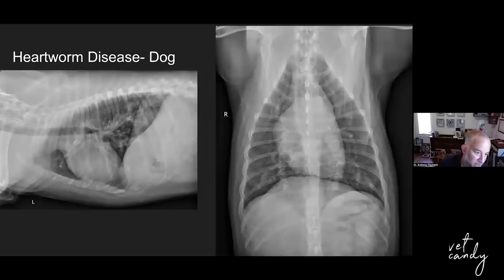And look at this pulmonary artery relative to the vein. Remember, we said artery is going to be here. That's the bronchus, and then the vein is ventral. Look at how the pulmonary artery is this thick and the vein is this thick. Let's go to the caudal lung lobes on the VD view. Look at this honker of a pulmonary artery right here, and then that poor bronchus is even being attenuated relative to the vein, which is right here. Okay, so huge pulmonary artery.